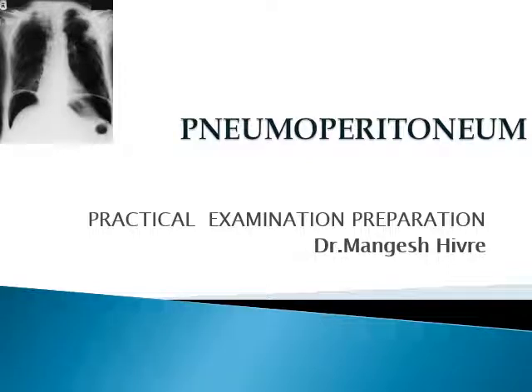Today I am going to discuss the topic pneumoperitoneum, which is frequently asked during practical exams. Gas is the body's own natural contrast medium, much of which is swallowed, and its appearance as the darkest density on X-ray films should now be familiar to you, especially in the abdomen as well as the chest. But most importantly, from the diagnostic viewpoint, owing to the variety of pathological processes, gas may escape from the lumen of the gut into the peritoneal cavity as well as into the retroperitoneal space.